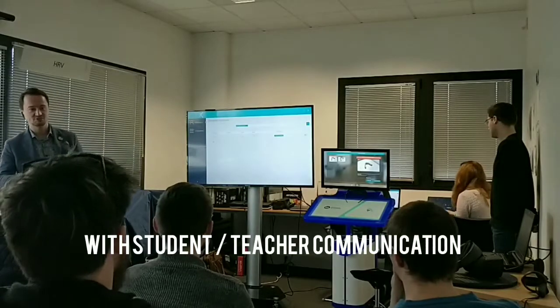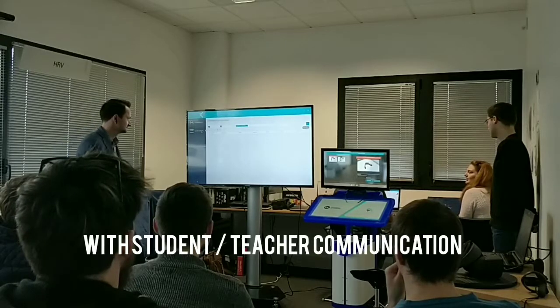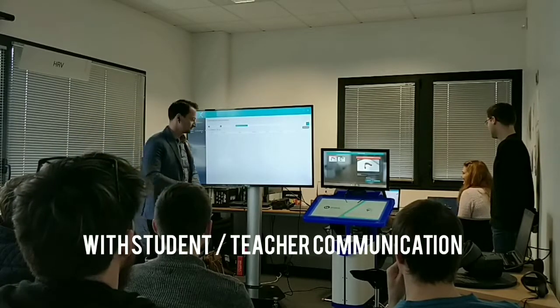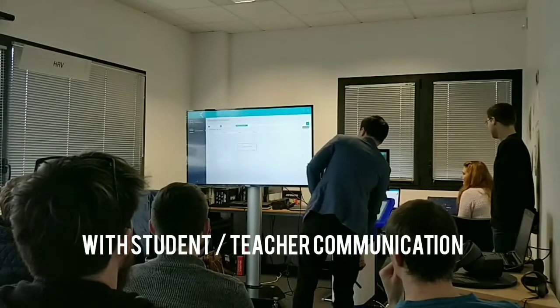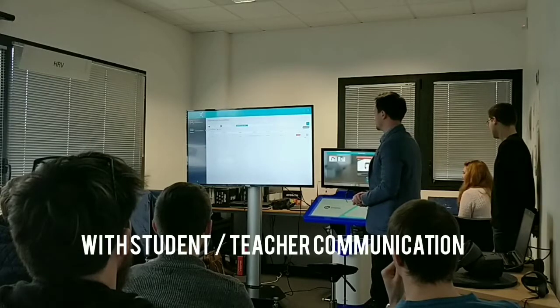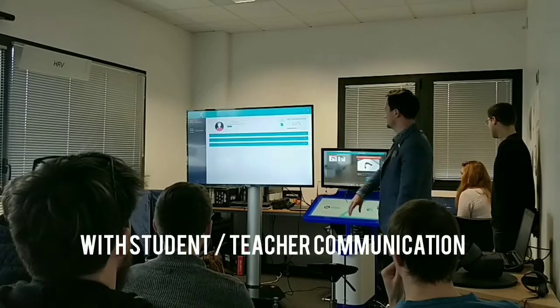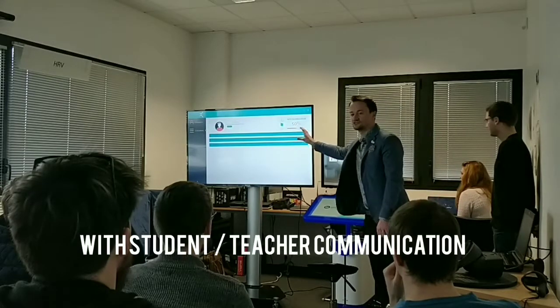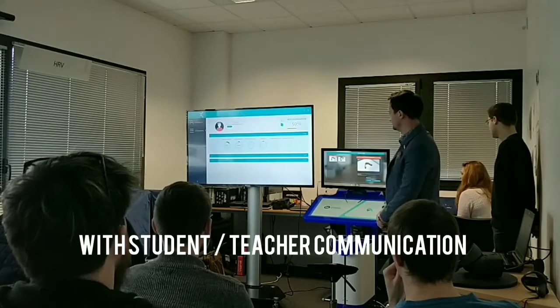They won't have access to any other students within the server. There we go. So we're just going to search the server for our new evaluation, which we found. And here we can see the simulator has graded the student automatically, and we can see the breakdown of that.